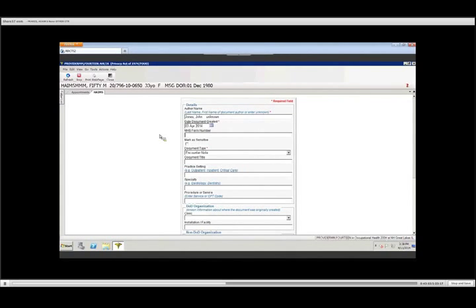From within HAIMS, many of the metadata boxes that we type information into have automatic drop-downs. The Navy forms are in there, the Air Force forms, the Army forms. There's even Coast Guard, DOD, and of course the standard forms.